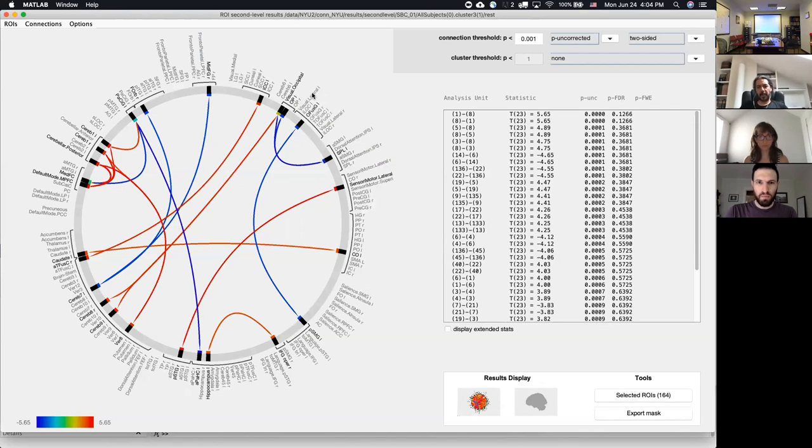And there is a bunch of techniques aimed at correcting for that multiple comparison issue in the case of these multiple connections. And they work very similar to these cluster level statistics at the voxel level, but they operate at the ROI level. And I had in the control box this particular display function that allows you to do these thresholding options, but it used to be a very complicated GUI and very difficult to operate.